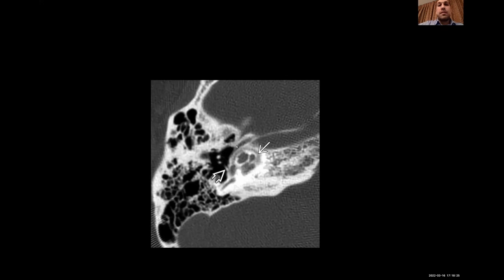Okay, this deficiency around the cochlea. This is the patient osteogenesis imperfecta. Okay, there are other abnormalities for osteogenesis imperfecta, the basilar invagination, Wormian bones, but this is lucency, which will not be sclerotic and will expand with time to involve the otic capsule. Okay, this is osteogenesis imperfecta. Just consider it is not in the 2B, it is in the 2A.